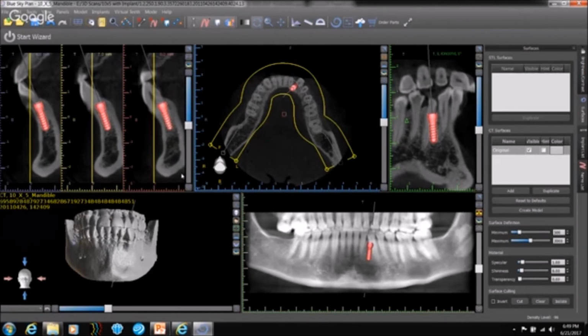I've seen an unusual case where it even joined the contralateral side, a loop or extension from the contralateral side, and joined it in the midline. But that's very rare. You look for the same principles. You use the same principles to identify a canal and a foramen, to look for an accessory foramen and an anterior extension.